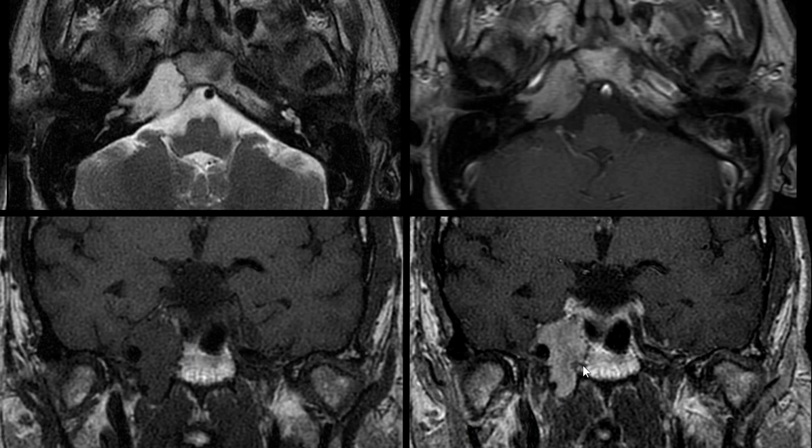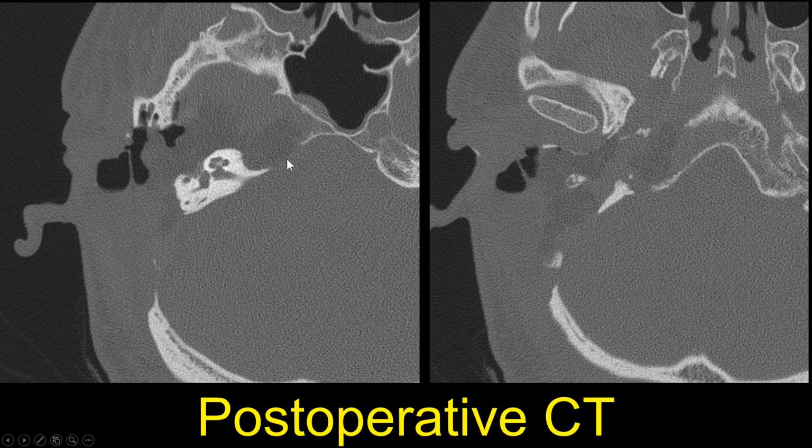And this patient had a very complicated kind of translabyrinthine approach to get to that petrous apex. Now, very nicely in this case, they resected the external auditory canal, they resected the ossicles as an approach kind of in front of the cochlea, a pre-labyrinthine approach to the petrous apex itself. So we see this fat packing at this location. And nicely, very eloquently, they were able to dissect and leave the bone around the facial nerve itself.